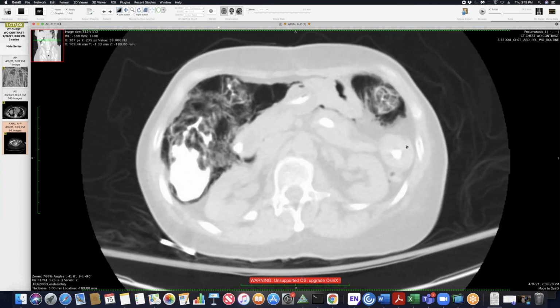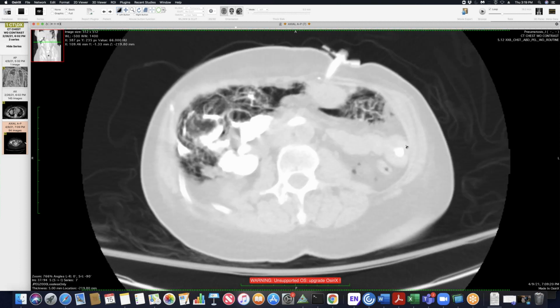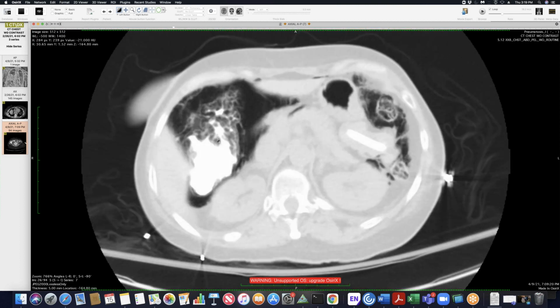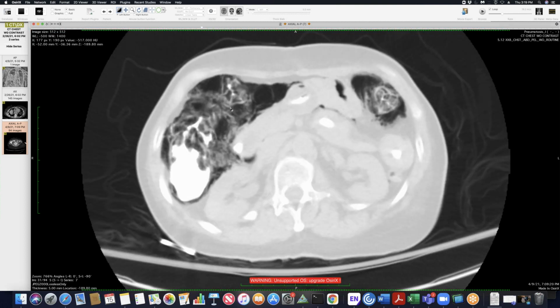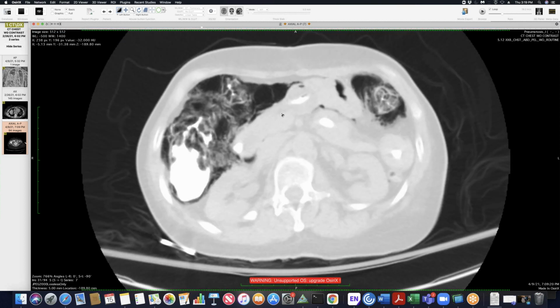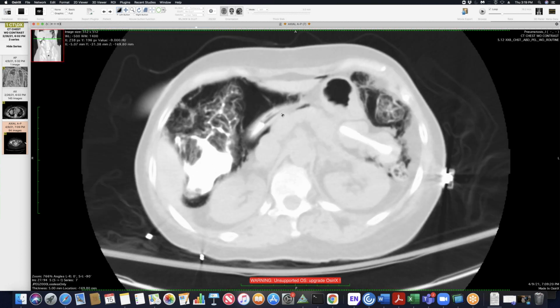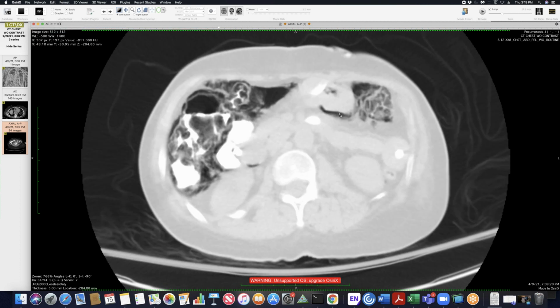So this case, courtesy of Art Stillman. This is a radiograph he read a few days ago. You can see a patient has a clamshell sternotomy here. This is a lung transplant patient. And the abnormal finding is not in the chest, but this pattern of bowel gas here is abnormal. And this is a case of pretty impressive pneumatosis intestinalis.